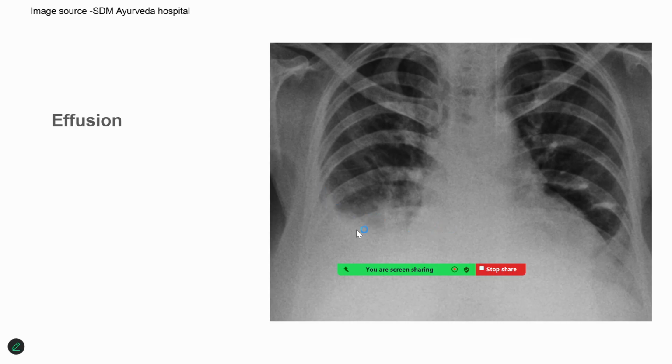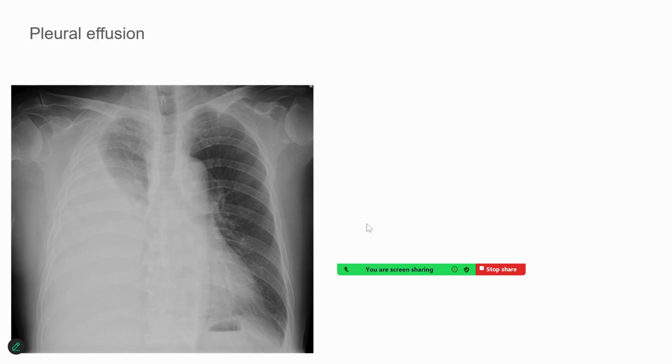Some more examples of the pleural effusion. It could be of quite a wide extent, and an untapped pleural effusion where there is no air and fluid interface would have somewhat an oblique margin, S-shaped margins or curved margins as such. It could be very extensive, and when the effusion is more, it may push the structures to the opposite side. The pericardium is pushed to the opposite side.